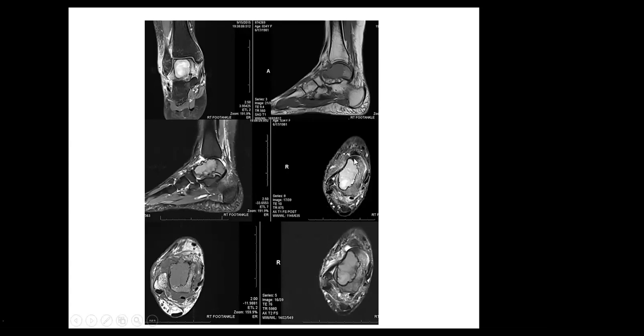But this is a solid mass, a solid tumor showing enhancement, in the subarticular area. There is surrounding osseous edema and surrounding soft tissue edema. There's also cortical breakthrough here anteriorly. And there's also joint effusion, like you said.